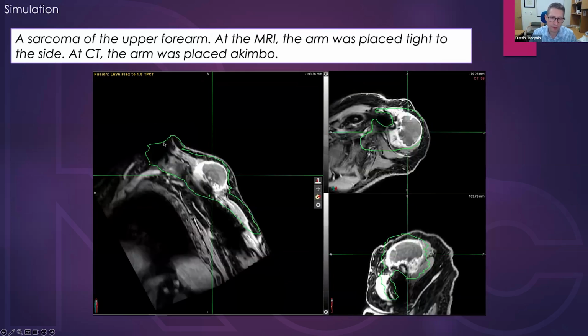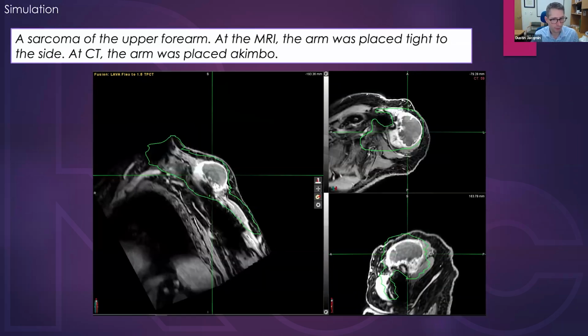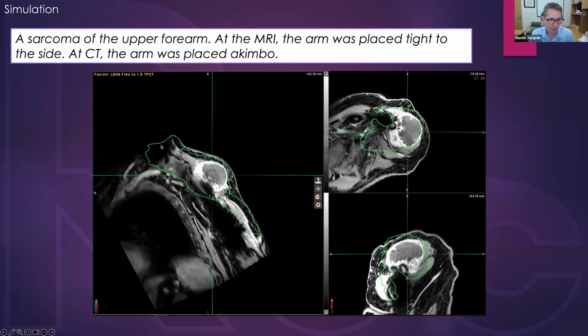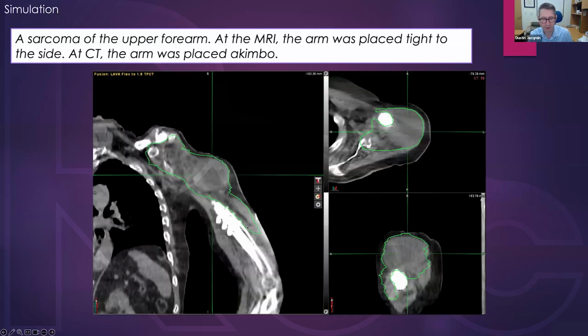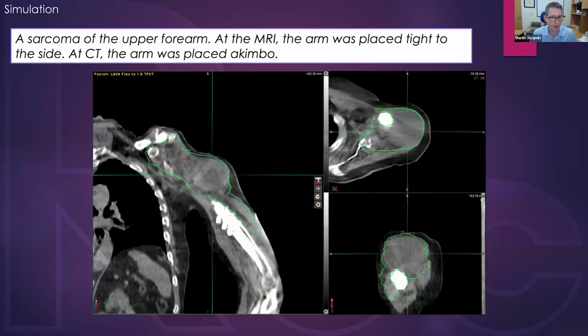When you have a case like this, it's good to communicate to the physician the uncertainties of the registration, and particularly where, saying like, hey, I focused most right here near the primary disease, and then the accuracy is going to be less and less good the further away you get from that. So be mindful of that when you're contouring. The physician can generally incorporate that information into their contouring practice and make the contouring as accurate as possible.